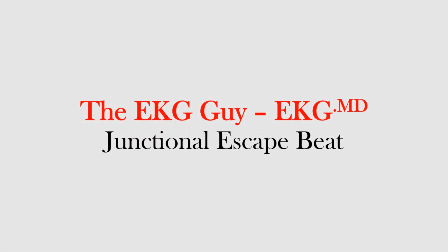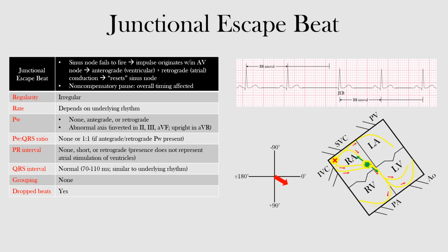In this lecture, we will discuss a junctional escape beat, including its origin, mechanism, and EKG features. A junctional escape beat occurs when the normal pacemaker fails to fire and the next available pacemaker in the conduction system fires in its place. In other words, the AV node senses that the sinus node did not fire an impulse, and therefore when its turn comes up, it reaches its threshold potential and the pacemaker fires.